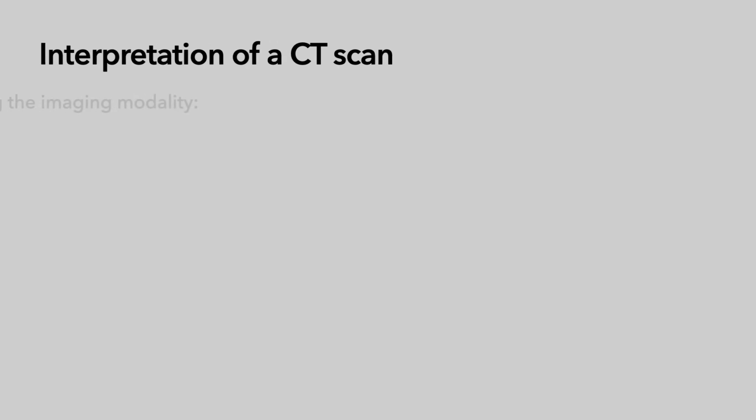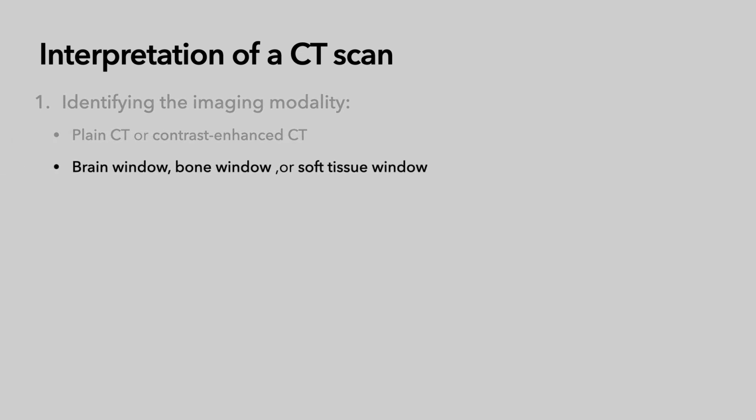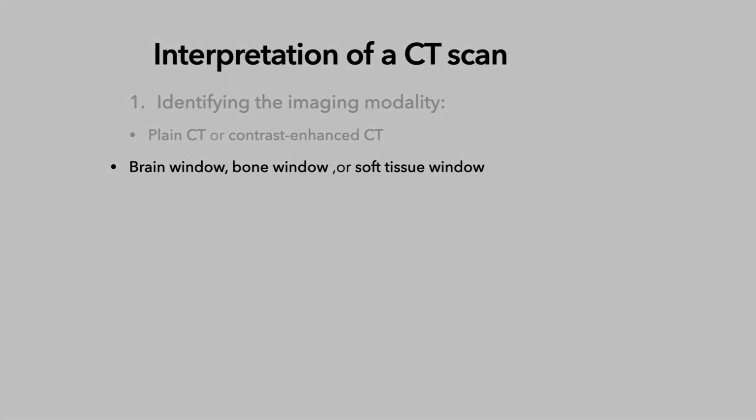So, interpreting a CT scan. We're going to start off by identifying the imaging modality. What am I looking at? Am I looking at a CT, an MRI, an X-ray? Is it contrast enhanced or plain? And what window am I looking at? And we're going to discuss what windows mean now.